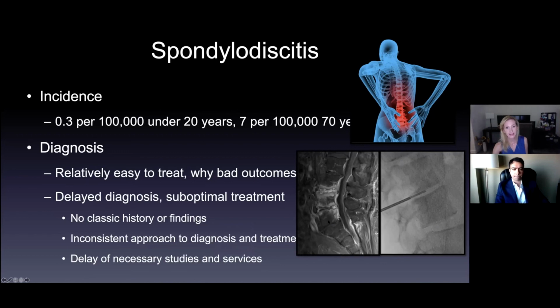Oh, again? Okay. So it's post-contrast. It's a post-contrast sagittal. There is fat saturation, which means, so you're going to see two kinds of post-contrast images. It depends what institution you are, the way you do them. I know Dr. Rasouli's institution does them differently without fat saturation. Good places do it this way. I'm just kidding. So you take out all the fat because fat is bright on T1 weighted images. It's hard to tell the normal marrow from the enhancement. So it's a little bit harder to see what's infected.